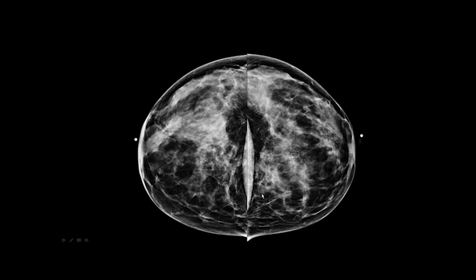Sometimes patients' breast tissue is so dense it goes up into the axillary tail, where you can't visualize the axillary tail on the CC. So it's really good to have the end of the parenchymal patterns in there. The structures should be well separated with good compression. As you can see here, there's a tiny, tiny fold medially.